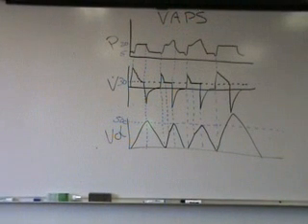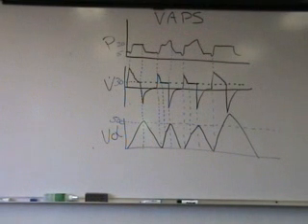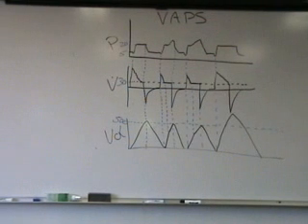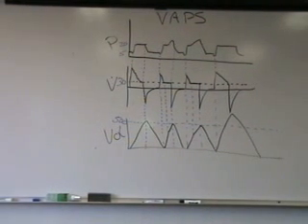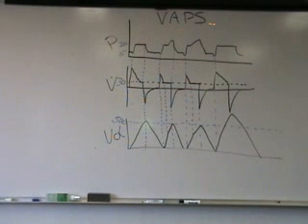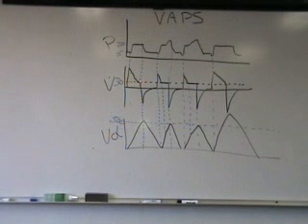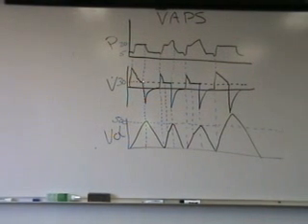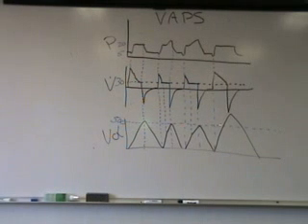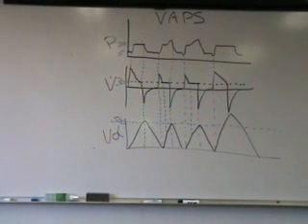Okay, so here we're describing volume-assured pressure support, a combined mode of ventilation that uses both pressure and volume as a controlling variable, depending upon what happens during the course of the breath. On breath 1 and breath 4, these look just like a normal pressure-supported breath. You'll see that the patient triggers the breath, the flow rate decelerates, and once the flow rate decelerates to a certain point, the ventilator says, has my volume been achieved? And in breath 1 and breath 4, the volume has at least been achieved that I had set. So at that point, the breath would shut off.